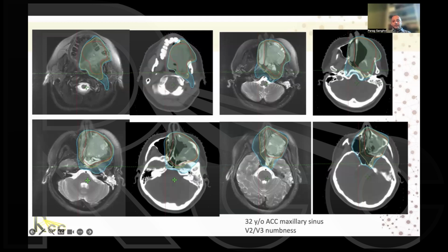So you can see going intracranially for this patient along through the pterygopalatine fossa, through the Vidian canal, through the cavernous sinus in these patients. And I wanted to show you, postoperative settings don't look nearly as pristine as the intact settings. The patients had surgery, so a lot of the bony landmarks are gone as you're tracing this for the patient.